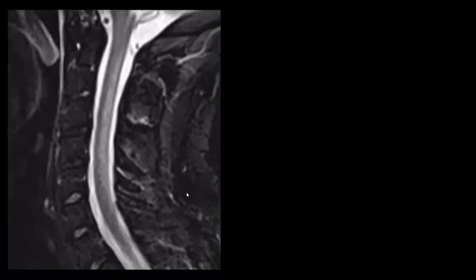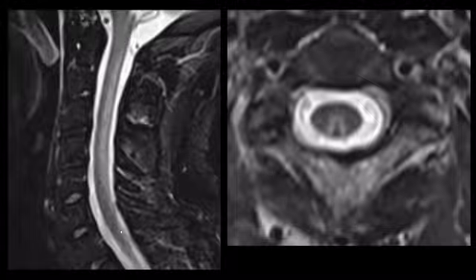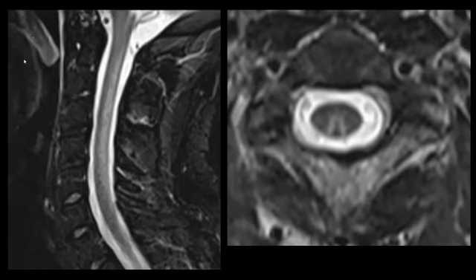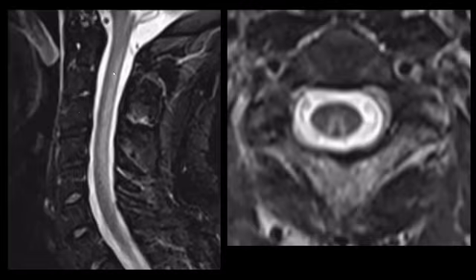So be skeptical. This is another typical example, and this is, I believe, more pathognomonic. This was a patient with sensory disturbances and sensory ataxia. The patient is known to abuse nitrous oxide, the kind of gas that makes you laugh a lot and used to be used as an anesthetic. We call it lachgas in Dutch, but I don't know how it's called in English.